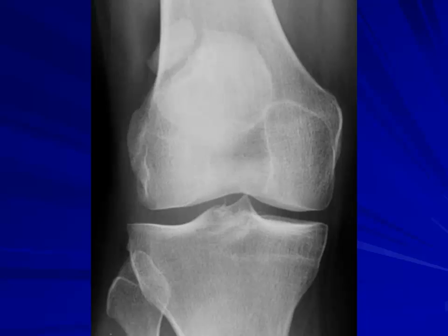But if you see focal uptake, then that could be because either there is lateral migration or there is abnormality because of continuous trauma, because of malalignment and maltracking. So that needs to be addressed, and the surgeons will take that seriously.